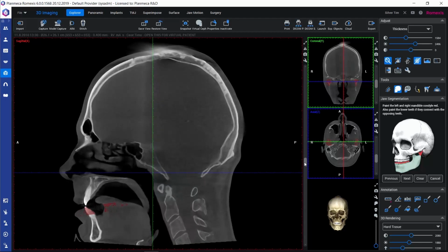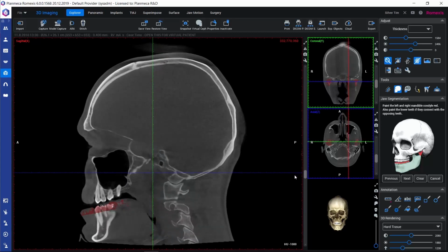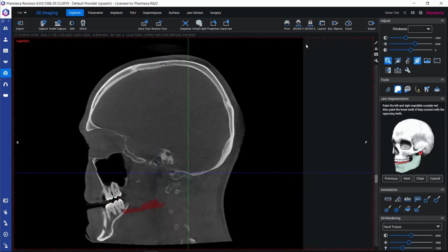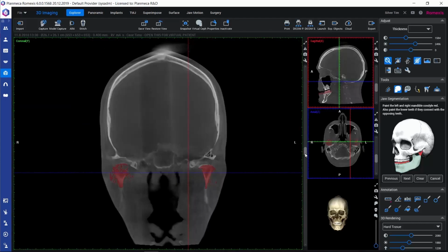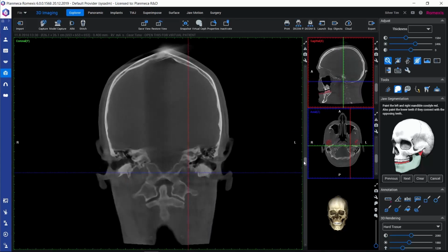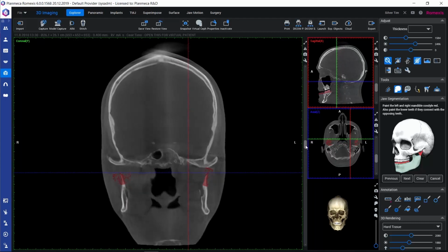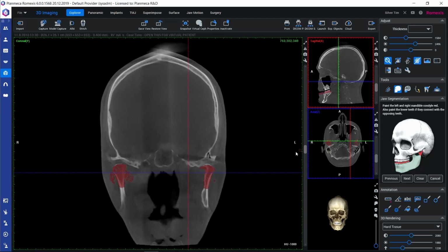So this is if it's important for us that all the teeth are covered, we could do these manual adjustments. So left mouse button for adding the paint, and let's check, for example, this coronal view if we have any paint here. Well, this looks about okay, but we can still take a look at the possibility of removing the paint as well. So we could use the right mouse button for that.